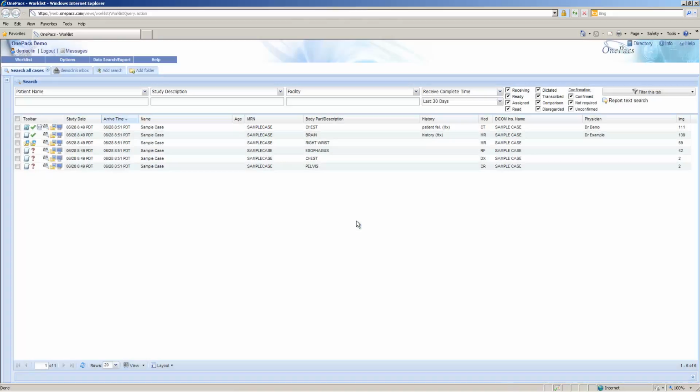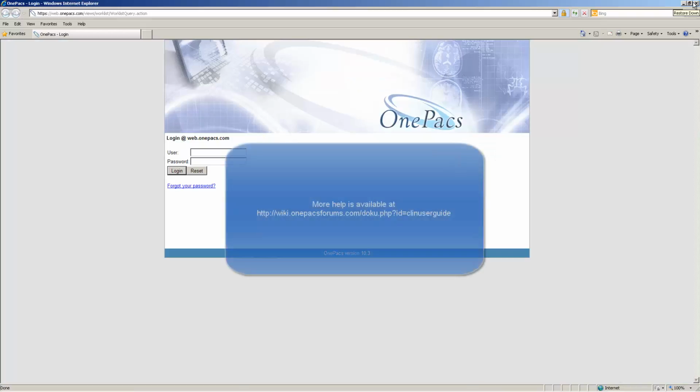This concludes this brief tutorial for a clinician on the OnePacs system. More help and documentation can be found at the listed website.